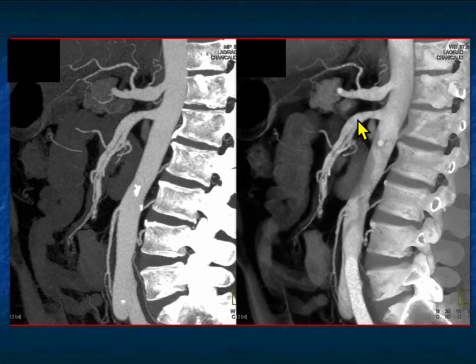It wasn't proximal, it was about 3 or 4 centimeters in, and then extends for over 5 centimeters. It's very important to recognize that on non-contrast you can see an aneurysm when it's large, but dissections, small aneurysms, vasculitis, you're just not going to appreciate in most cases unless you give IV contrast.